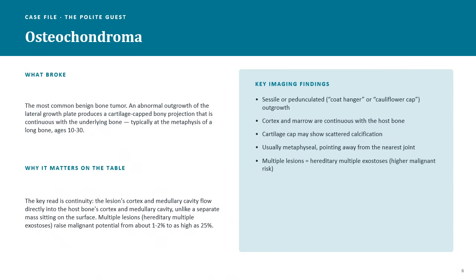All right, the thing we are looking for here is continuity. We're looking for things like the lesion's cortex and marrow flowing directly into the host bone cortex and marrow.